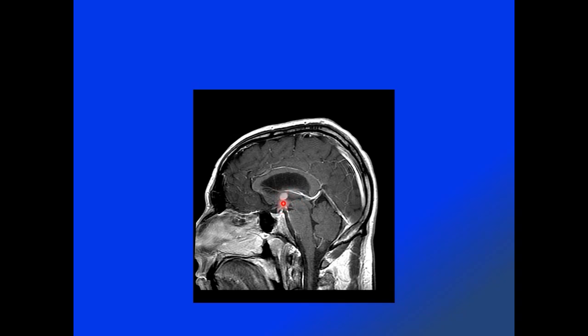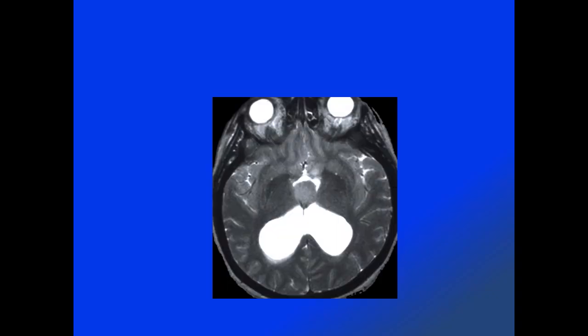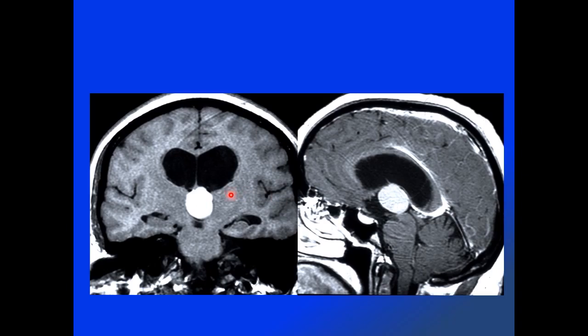ventricle without significant enhancement. In a different patient, we have a larger lesion, which is isointense to gray matter within the third ventricle, associated with hydrocephalus. Pre-contrast T1 coronal images again demonstrate prominent hyperintensity of this lesion, and sagittal post-contrast image again demonstrates no additional areas of enhancement.